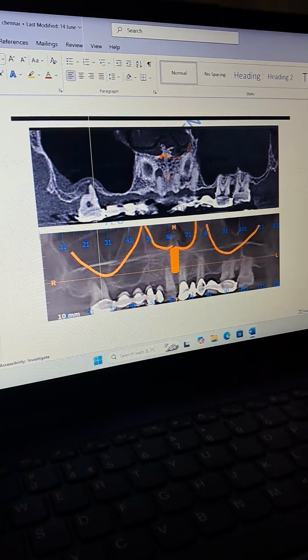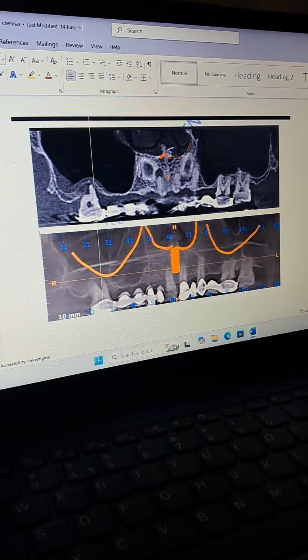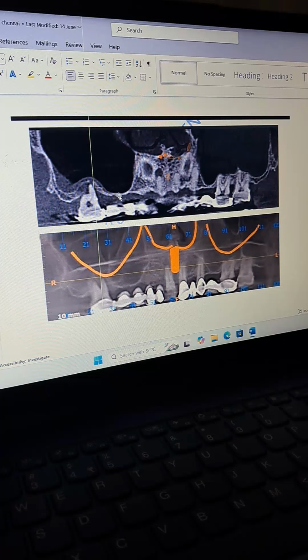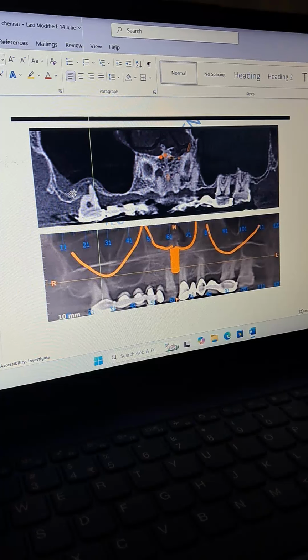The patient is a 48-year-old male who has been operated for coronary artery bypass, and he was on blood thinners. So I did this case not in my clinic, but in consultation. The things I want to highlight in this case is the bone rim, 1 mm, 2 mm bone on the right side, following the same pattern.